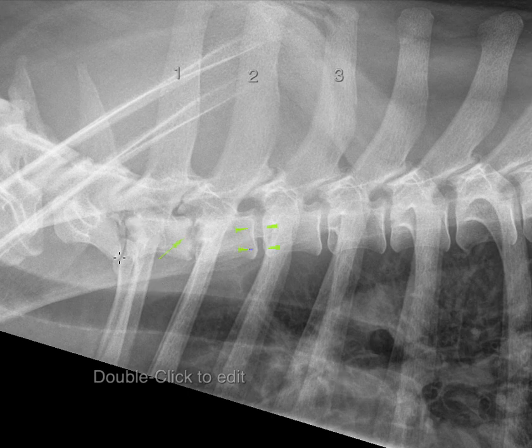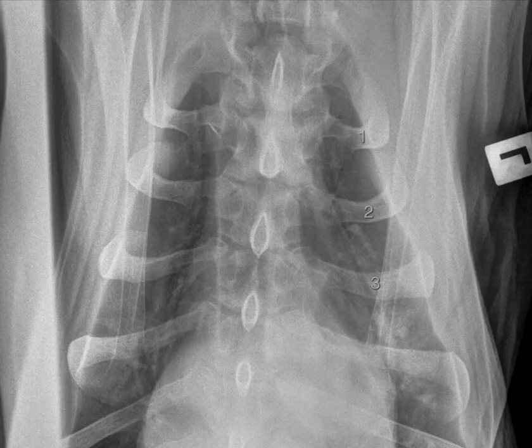I'm also suspicious of a reduced opacity here in the cranial end plate of T1, but it's on the edge of the film and there's a bit of obliquity, as well as the rib head is superimposed slightly. Let's pursue these impressions on the ventral dorsal view.